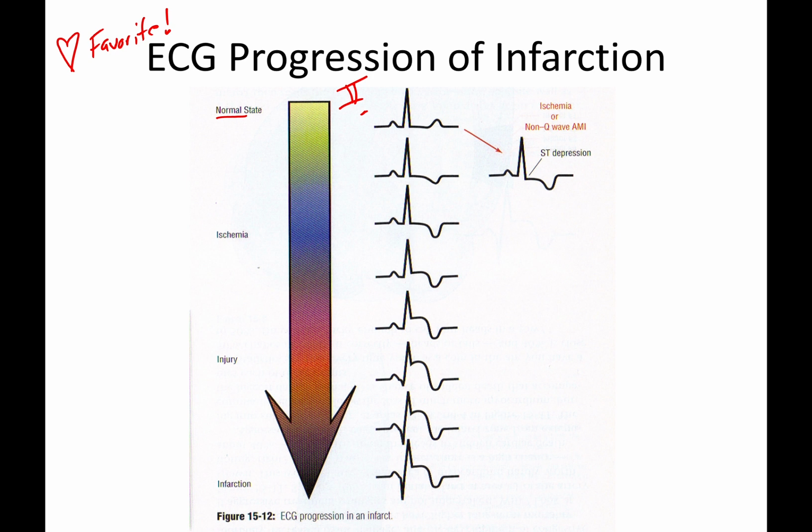And then as you progress through stage 1, stage 2, and stage 3, as you progress towards infarction, you will see the same EKG change in that lead. You'll notice how we have flipped T waves, and that flipped T wave will progress throughout. You can even see how the shape of it changes a little as time goes.